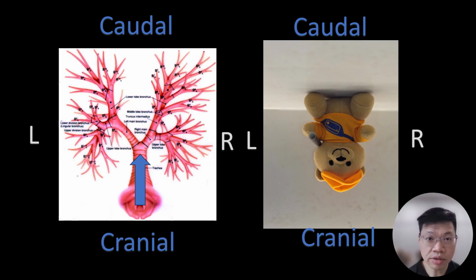During bronchoscopy, to enter the left lower lobe LB6 segment, we take a left turn at the carina, following which we depress the lever to look upwards, and we move in the anterior to posterior direction into the LB6. The teddy bear on the right mimics the position of the patient during bronchoscopy, with the scope moving in this direction.